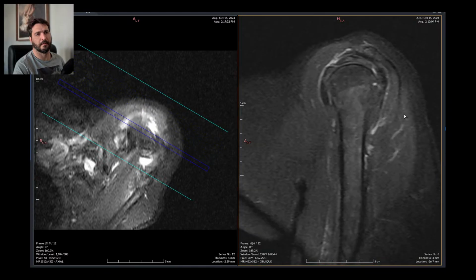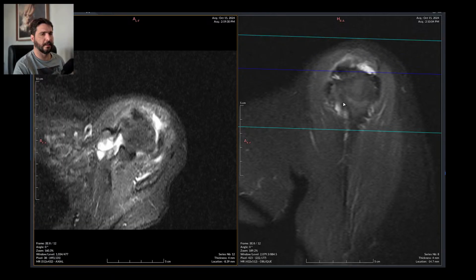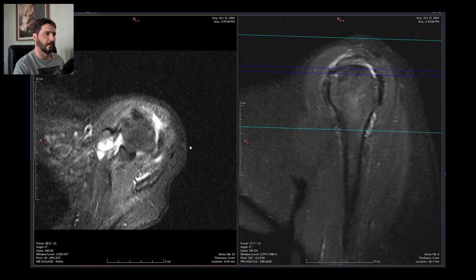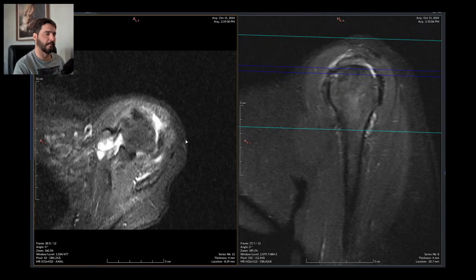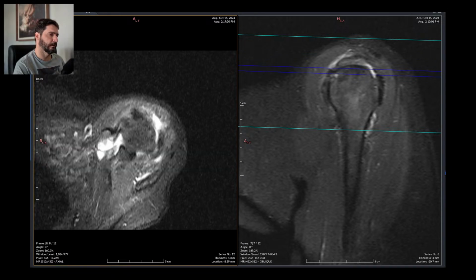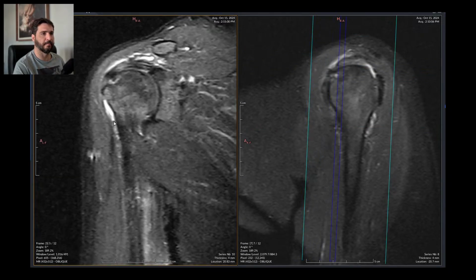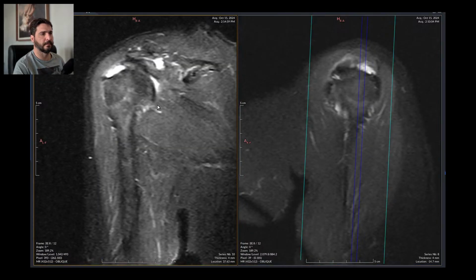So this is a tough one to measure because it's angled wrongly. See, it should have been angled right like this, and it's angled twisted, so it's a tough one. I don't know. How do you measure this? Yes.